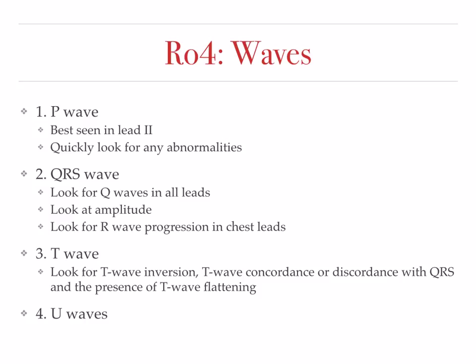The final wave you want to look for is going to be a U wave. A U wave, if present, could be an indicator of hypokalemia and needs to be assessed further.